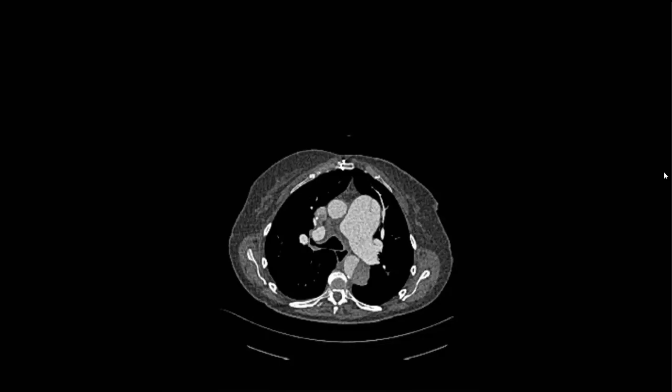So to sum it up, what do you think it is? Some collagen disease probably will be there. Multiple intimal tears could be like Marfan's, Ehlers-Danlos or any other congenital diseases. Make it broad, keep it broad. It could be connective tissue disease, fair enough.